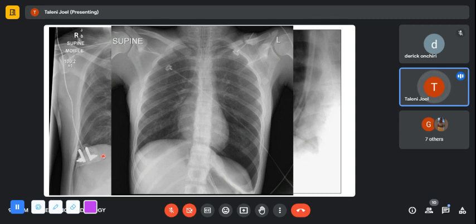Then this chest radiograph is demonstrating the double diaphragm sign. So what we are seeing is that we are able to see the dome of the hemidiaphragm as well as anterior. This bit here is the anterior portion of the diaphragm. And so this is referred to as the double diaphragm sign. So you have double diaphragm, you have also deep sulcus sign, and you also have a continuous diaphragm sign.